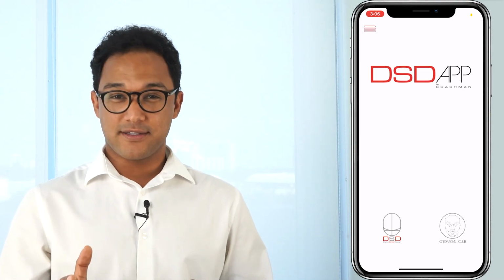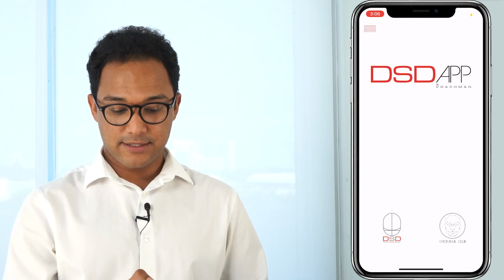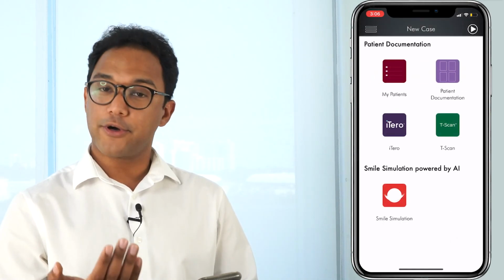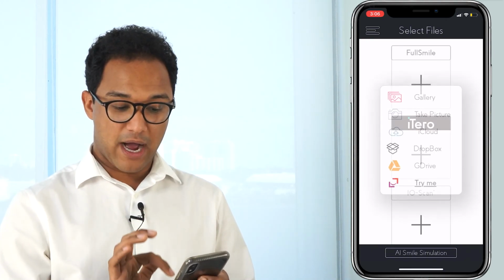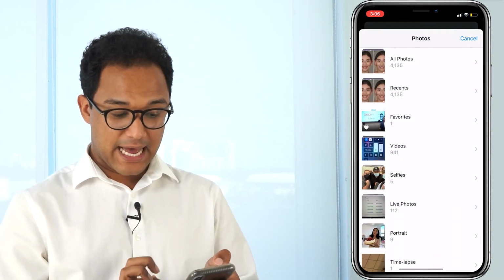Let me show you another case. So the process is basically the same. I'll go to Menu, New Case. I'm gonna go to Smile Simulation. Then I'll tap on this plus sign in the full smile box. I already have the picture of my patient here, so I'm gonna tap on Gallery.